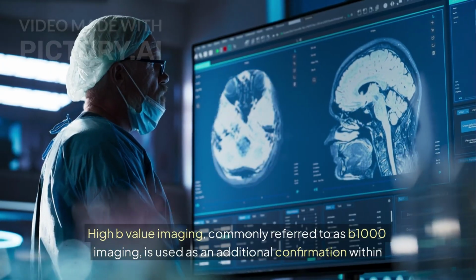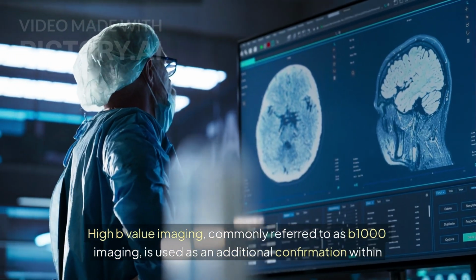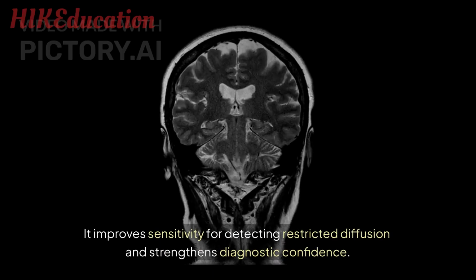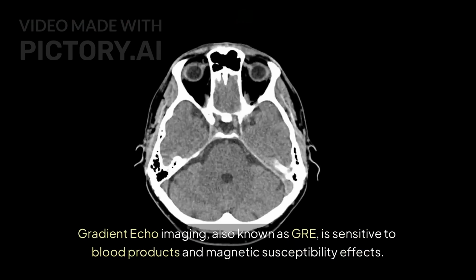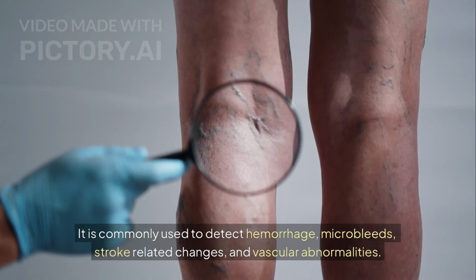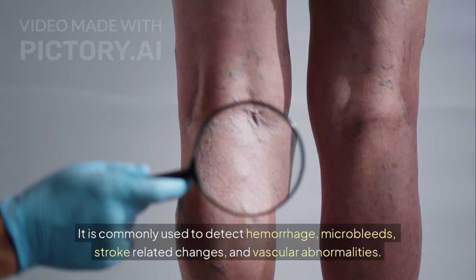High B-value imaging, commonly referred to as B1000 imaging, is used as an additional confirmation within diffusion imaging. It improves sensitivity for detecting restricted diffusion and strengthens diagnostic confidence. Gradient echo imaging, also known as GRE, is sensitive to blood products and magnetic susceptibility effects. It is commonly used to detect hemorrhage, microbleeds, stroke-related changes, and vascular abnormalities.